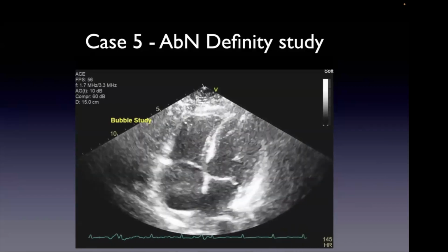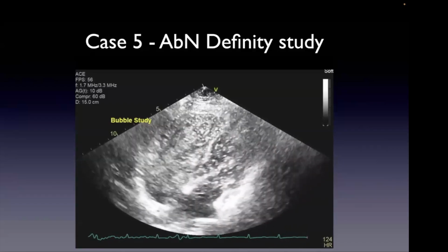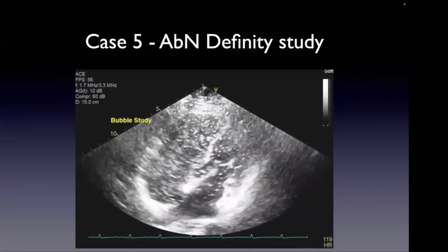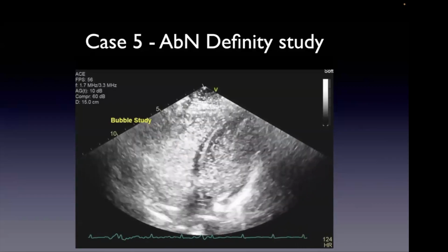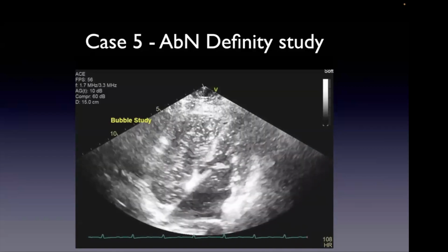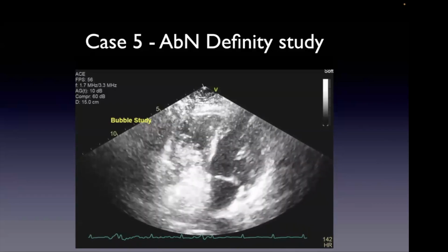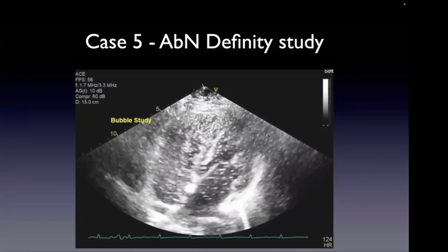Same case? Yeah. So it's kind of funny. I'm not sure if it was done before or after. It might have been done after, actually. So, for extra bonus points, what's the underlying diagnosis other than the intra-atrial shunt, which is probably a PFO in this circumstance? But I know why you said ASD. Why did you say ASD?